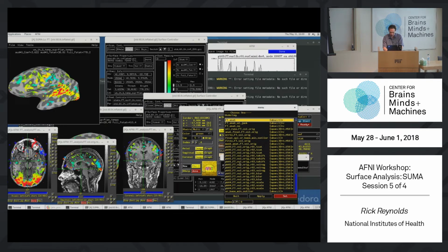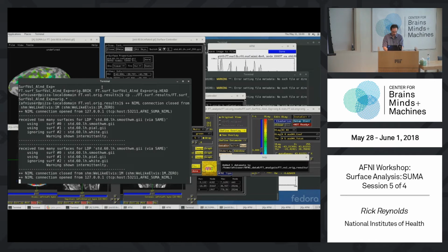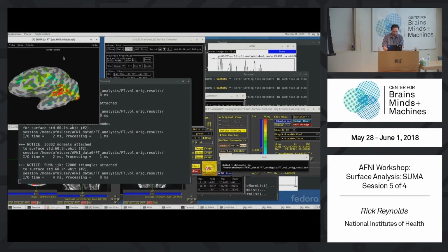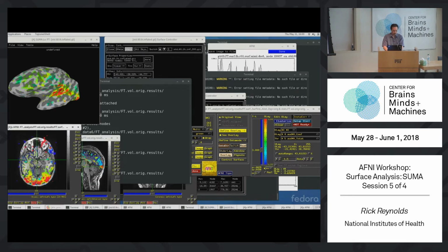So now it has that data set. Should be on the bottom. Okay, one more try. Closed and opened. Force it, and there we go. So now we have surfaces in here. Now they are talking.